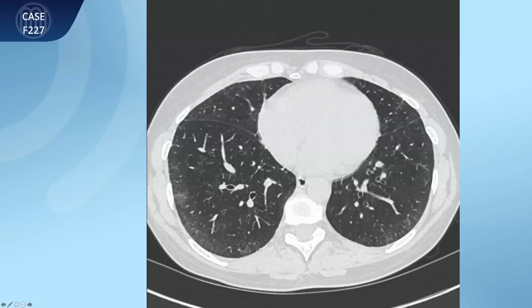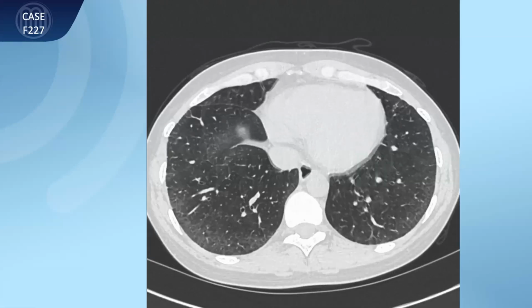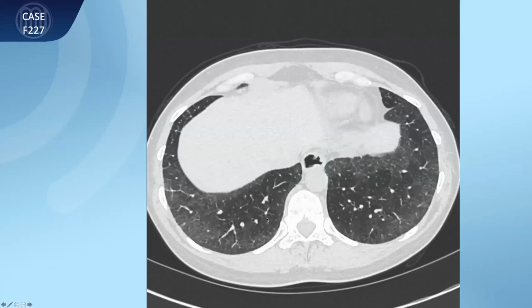Then the next thing we do is look for signs of fibrosis, because ground glass in and of itself is not necessarily a fibrosing lung disease. If you showed me this in a patient coming in with acute symptoms nowadays, I would have the suspicion that this is COVID-19. So in and of itself, ground glass is nice, but not diagnostic. It just raises the suspicion of fibrosis.